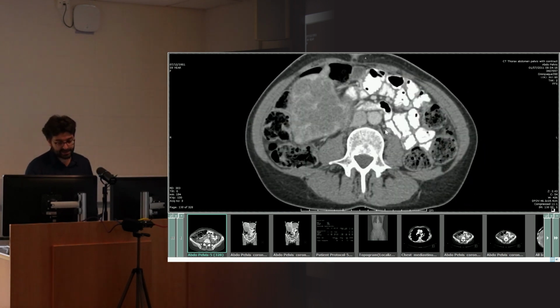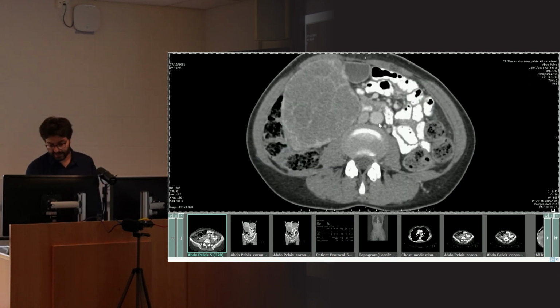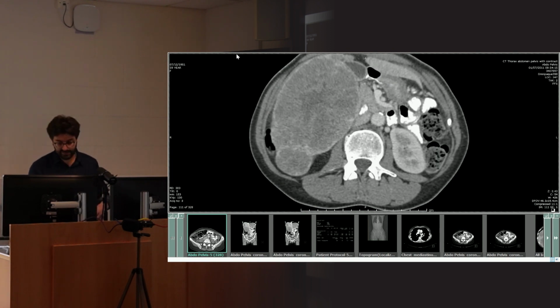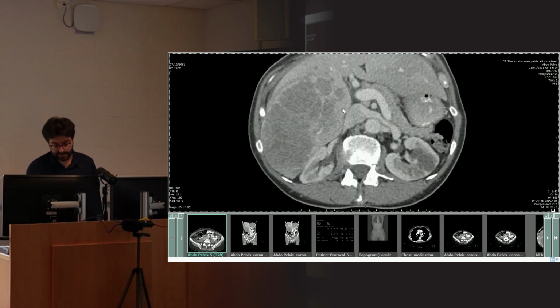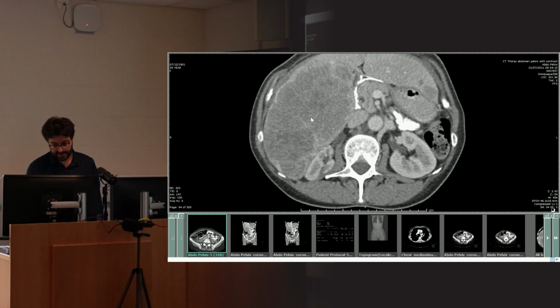And so how do you think this spread to the liver? Well, that'll be hematogenous. It could also be nodal as well, but it's most likely hematogenous, just given the fact that you can quite literally see the tumor growing up the vein. And where's that vein going to go? Well, it's part of the portal system. So, of course, it's going to drain into the liver, which is why colon cancer spreads to the liver. So this is a nice example of a colon cancer.